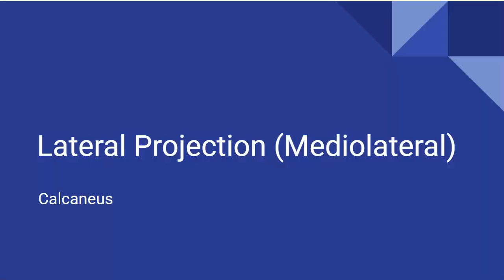Let's move on to the lateral projection of the calcaneus.